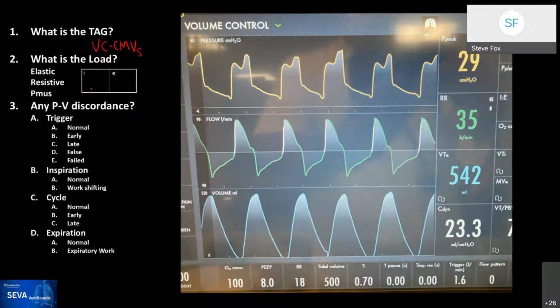If we look at the pressure waveform, it also has this downward deflection in the middle and the upward deflection at the end. In terms of trying to figure out why, if the patient is making some inspiratory effort, then it would downwardly deflect the middle of the pressure waveform. So that's probably why. And then maybe beginning to stop the inspiratory effort toward the end of the inspiration.